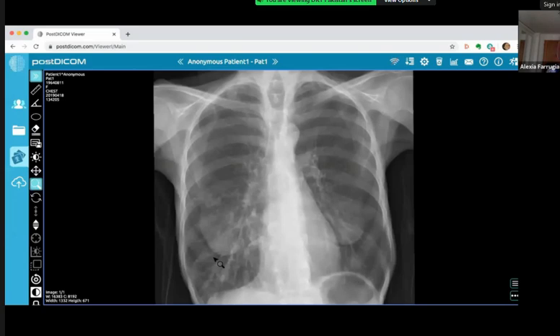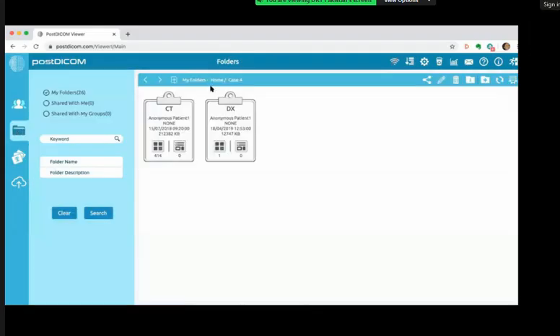As you said, the differential diagnosis would include TB, and it would include other causes of bronchiectasis as well. But because of the distribution in the middle lobe and lingula, that would favor Lady Windermere syndrome or Mycobacterium avium complex infection in the appropriate clinical scenario, in this case, an elderly female with pre-existing lung disease. Okay. Great, thank you. You're welcome.